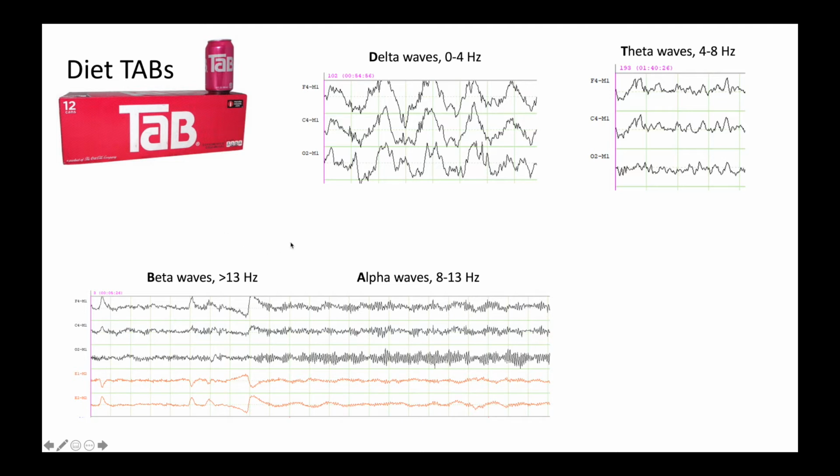The difference is eye closure. When you close your eyes, and this is eye closure right here, we'll talk about the eyelids in a sec, but just take my word for it, this is the patient closing their eyes. That's what these wavelengths are right here. When you close your eyes, you stop processing visual information in the occiput, in the occipital cortex on the back of the head. And when you stop processing visual information, there's less neural activity, meaning there are fewer vectors to cancel each other out. And so you start to see the emergence of this background pattern, these alpha waves.